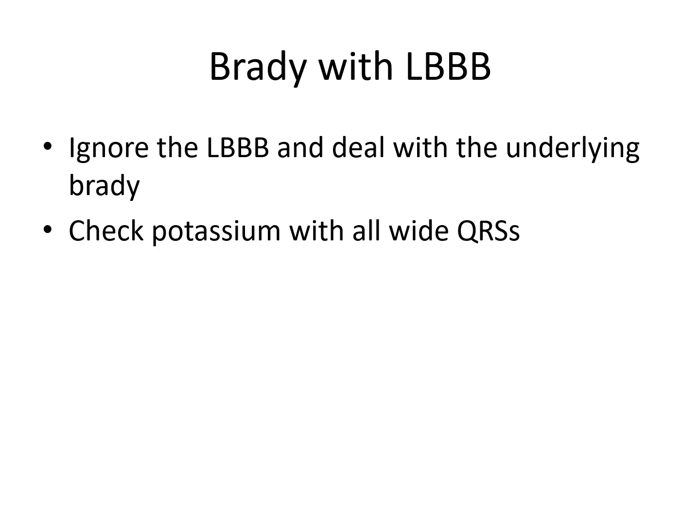And again, we're going to check drugs, infarct, electrolytes, and anything that has widening of the QRS, we're going to pay particular attention to potassium. We will discuss later about whether a new left bundle is an equivalent to a STEMI and how to diagnose acute ischemia in the presence of a left bundle.